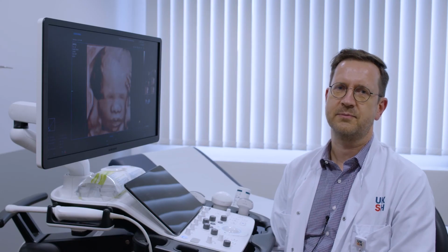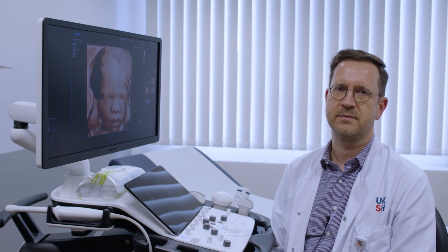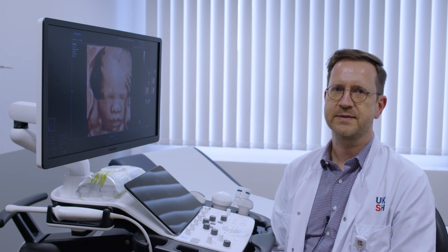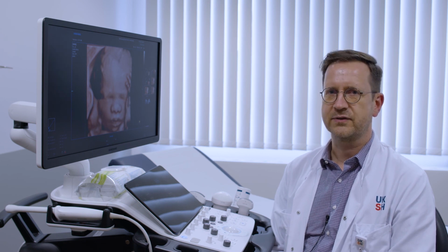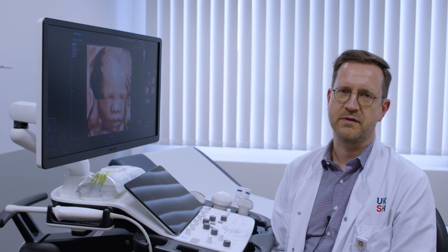I've now tested Samsung's new ultrasound machine V8 for several months, and I have to conclude that this system has a brilliant performance with brilliant and super B-mode images, very crisp and clear Doppler interrogation, and in 3D ultrasound the machine has several features for any purposes, and I clearly recommend the use of this ultrasound machine.